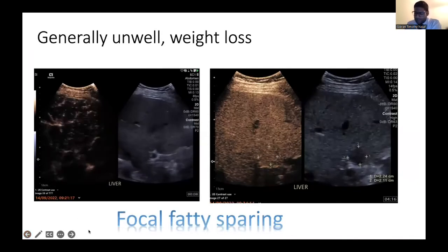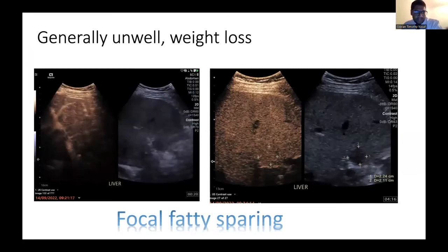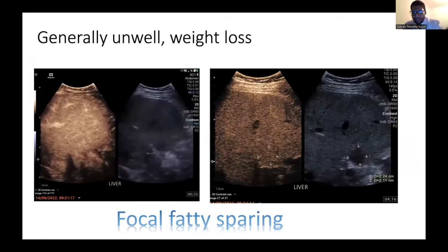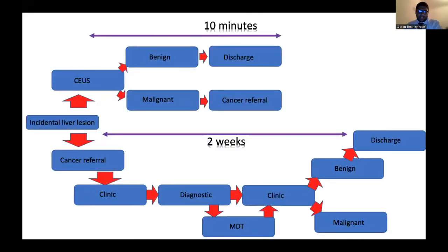This is something else, and this is going to allude to a point I made earlier. A focal liver lesion, again, hypoechoic on a background of a steatotic liver. But what does it do? It enhances the same as the liver in all phases. It does not wash out. This is focal fatty sparing, or a so-called pseudo lesion.